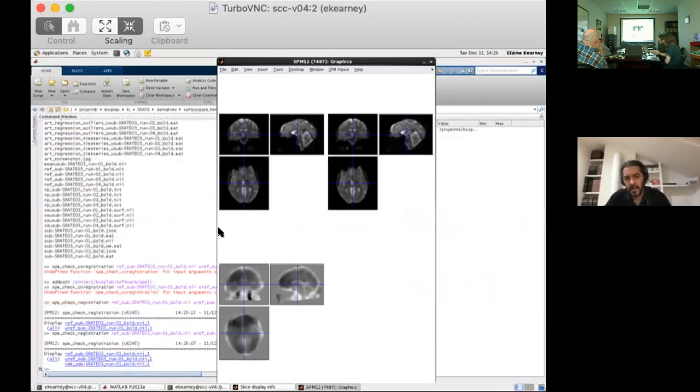things that are wrong in the data are signal dropouts, and this cannot do anything about signal dropouts. It just does something about signal distortions, the spatial distortions, but I don't know. To my eye, that distortion correction doesn't seem to be applying. The space seems to be the same, but the correction doesn't seem to be applied.